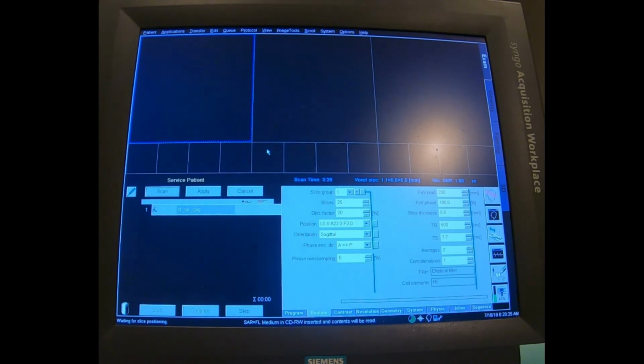If, for instance, that was to get out of control, or they thought the patient was going to have too much, or the RFPA is giving out too much or not enough, and it doesn't match the TALES, you're going to get what's called a runtime SAR error, or a power absorption limiter error. It's usually in the form of too much RF. Generally, if the system doesn't have enough, it'll compensate and kick out more. But that's a service issue.